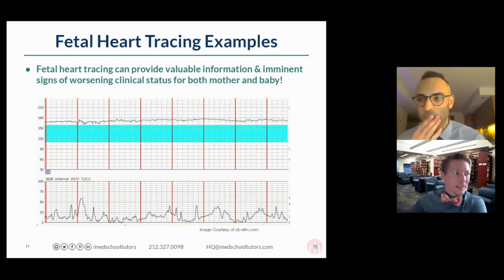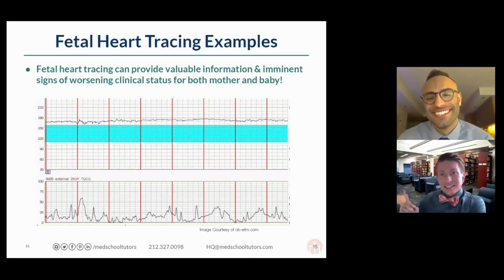And we have at least, there we go, two good answers. So Shreya, good answer, and Wayne, good answer. Listeria. Listeria can actually cause chorioamnionitis and cause this fetal heart tracing when the mom presents. Listeria might be fairly innocuous in the pregnant mother, not good for the baby though, and the chorioamnionitis that manifests will lead to this fetal heart tracing and probably a tender abdomen, uterus picture.